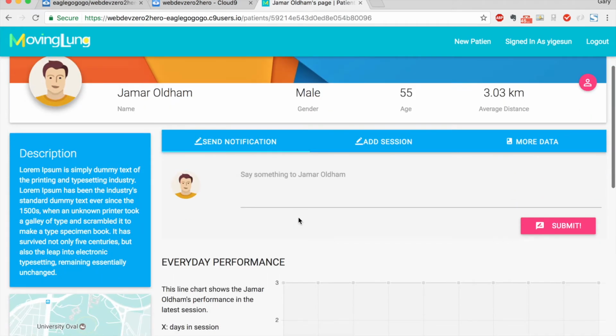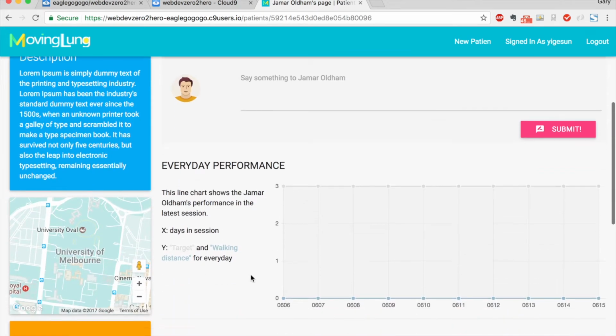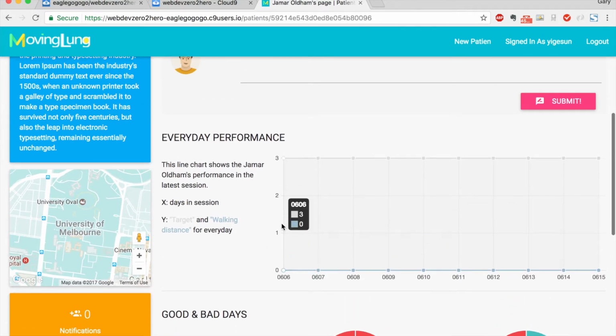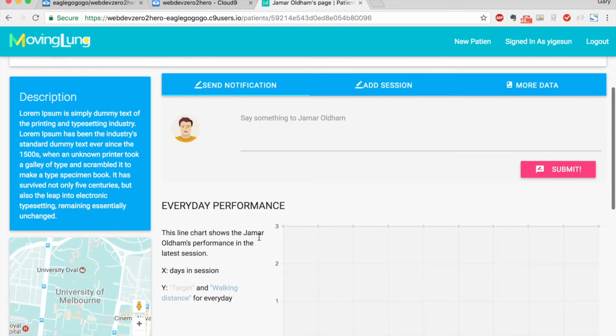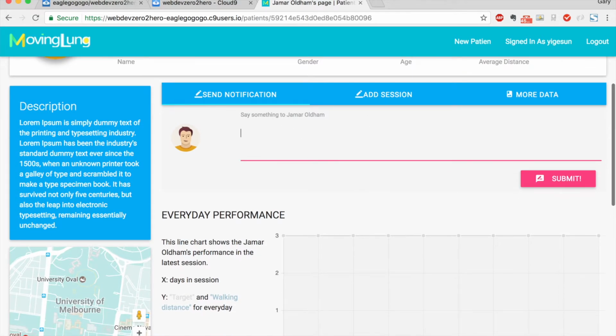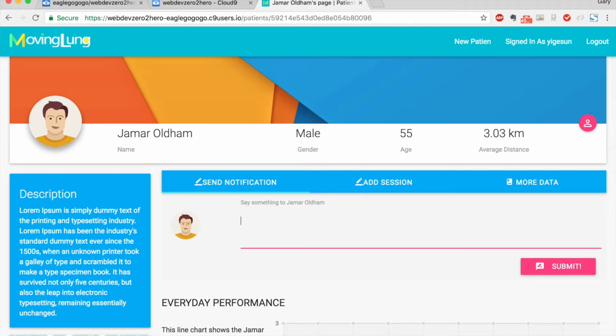As I said before, I've already set a session for this patient, and I want to tell the patient to walk. I use the notification feature, like, you should walk from today. Submit.